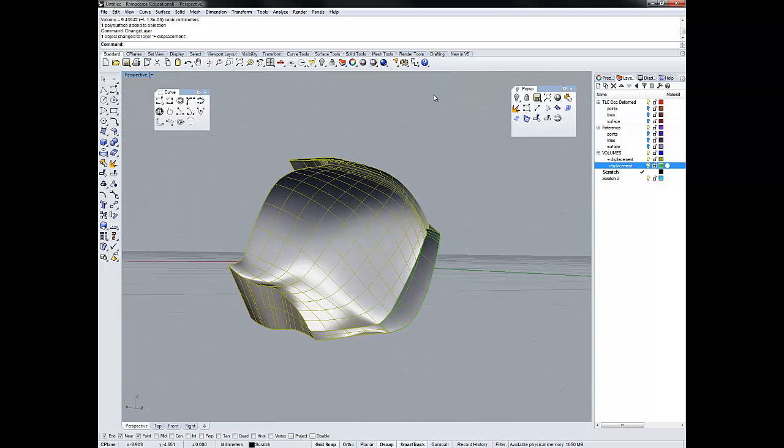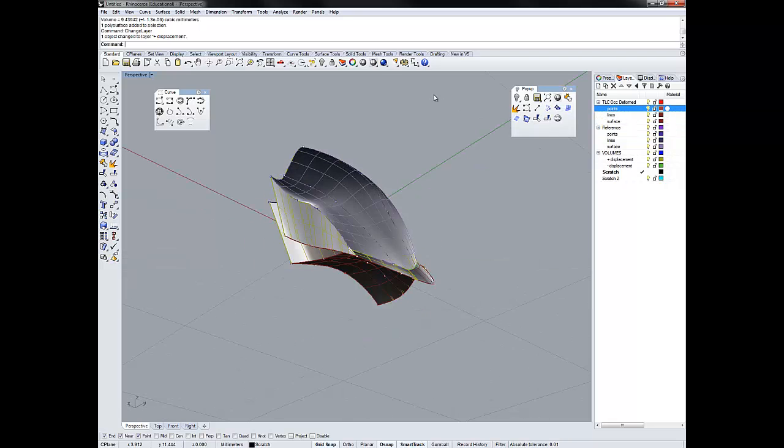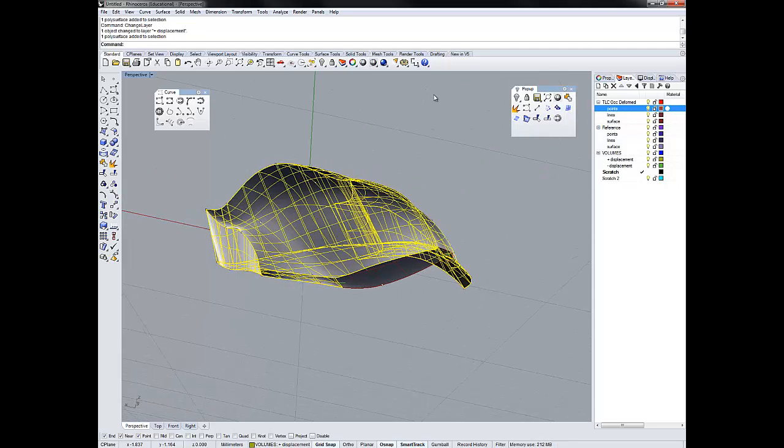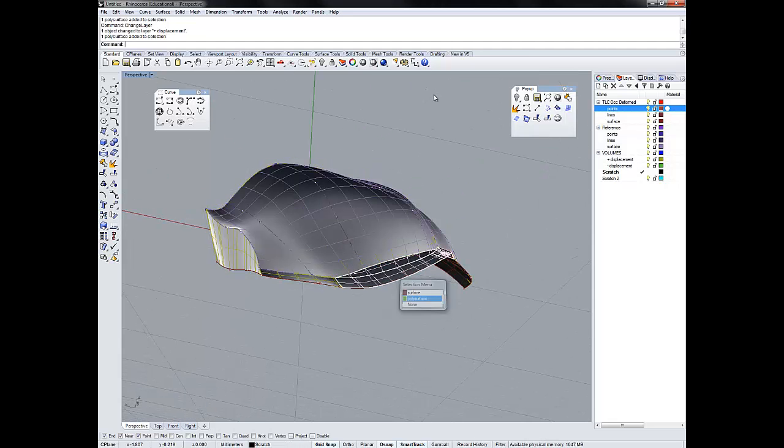The end products of this would be this 3D file, the lines, points, and surfaces corresponding to each of the surfaces, and also the volumes that you would obtain from both the positive volume displacement and the negative volume displacement.